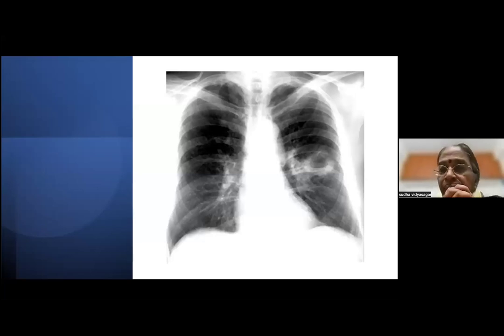Yes. What is that now? Lung abscess, cavity. Okay. So there is one cavity here on the left side. There seems to be some amount of fluid level. So remember, a tuberculous cavity hardly has any fluid level. It always drains because most of the times it's in the upper lobe. Whereas lung abscess will have a nice fluid level. But the point is, there's no straight line like that. So when you see a lesion like that, you have to go with the history.